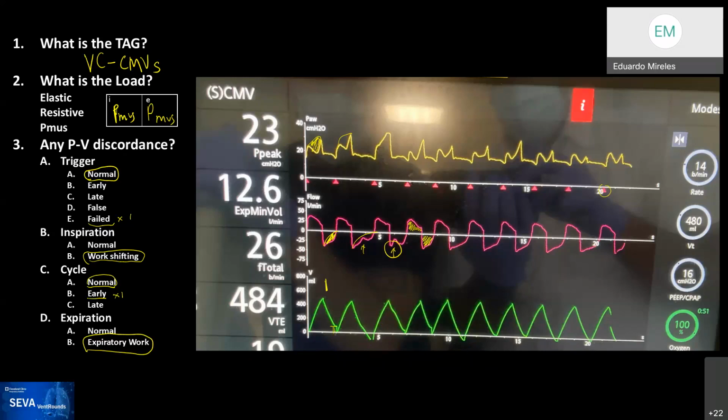So that kind of highlights those behaviors, and you can see that in this breath and in this breath, so in A and B, the amount that the patient inhaled and exhaled was exactly the same, even though the waveform may look like there's Auto-PEEP, right? Good observation, Woody. There's a good take-home message from this, and that is volume control is defined as inspiratory volume preset. Volume control only applies to inspiratory volume. The patient is free to exhale as much or as little volume as he wants, because exhalation is pressure control, not volume control. Excellent. That's a great message.